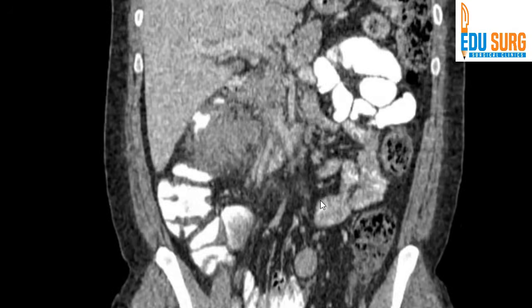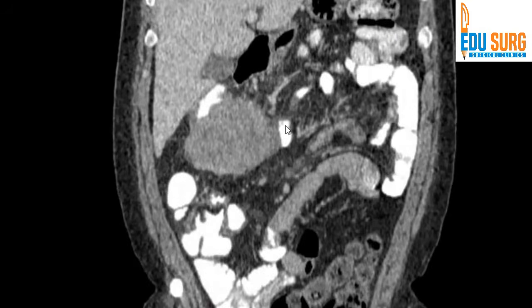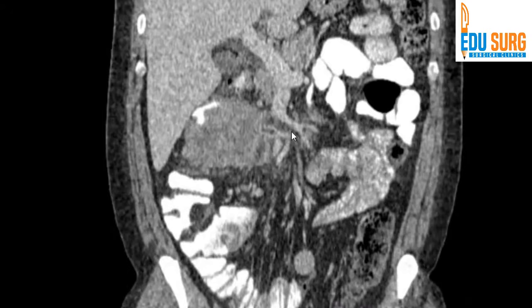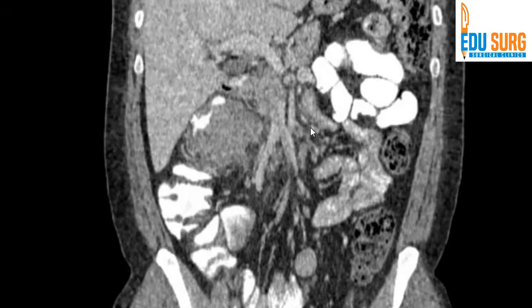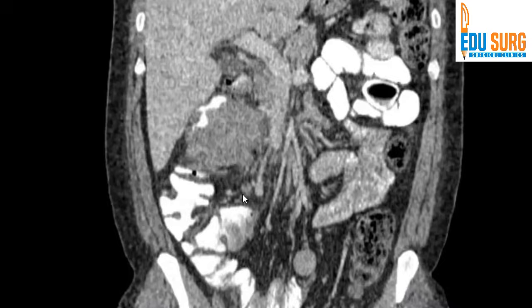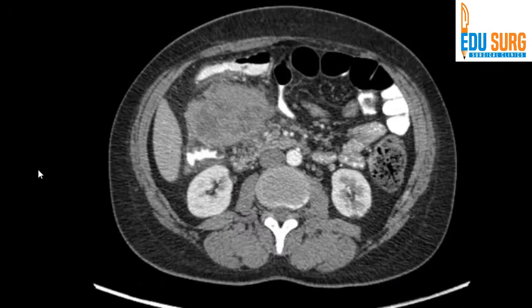Of course, this needs a lot of dissection because the planes that are so well visible on CT are many times not visible when you operate the patient. But of course, the SMA is far, so superior mesenteric artery is not involved. You can see a branch from SMA into the tumor, which will need ligation. And the ileocolic vessel that we were seeing, these are the branches that need ligation, right? So that is the surgical planning in this case.